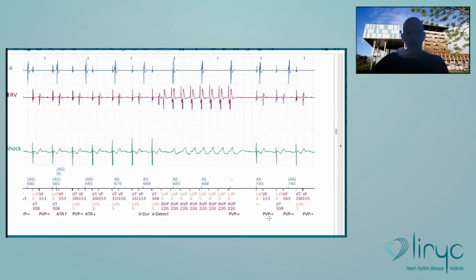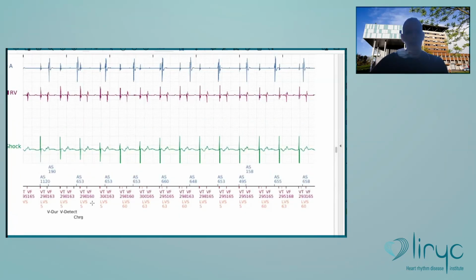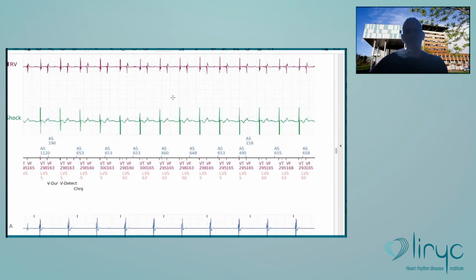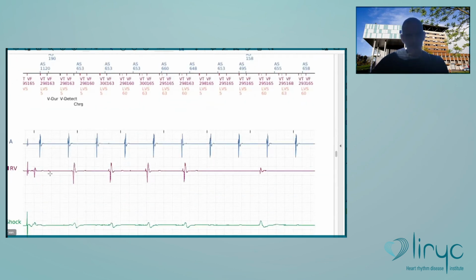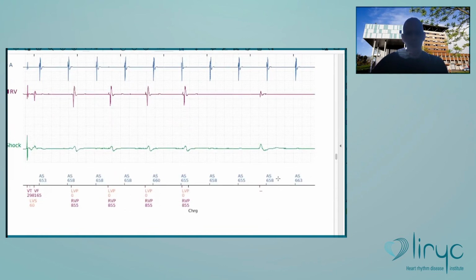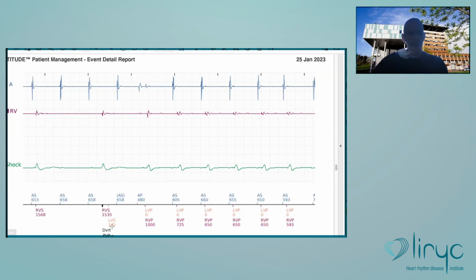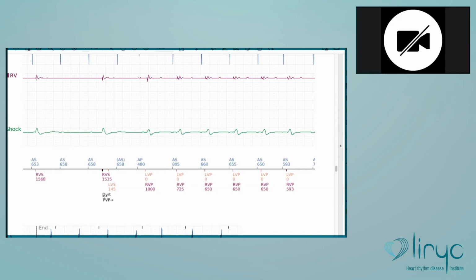Okay. Luckily, here you see that when you arrive at the time of the shock, you start charging the capacitors, and luckily you stop pacing. I don't think the physician has seen everything, because you cannot know that you will charge the capacitor at this time. But when you charge the capacitor, you end pacing, and therefore at the end of the charge, you see the way it works: the first signal is ignored, and then 1, 2 out of 3 are slow, so the shock is diverted. Okay, the charge is diverted. Okay, that's clear? Yes. Okay for you?